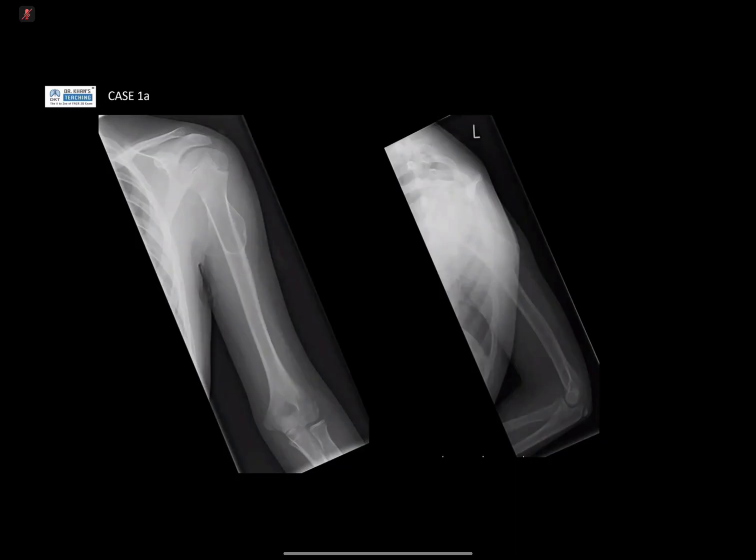Excellent. I'm sorry, I didn't catch your name. What was your name? Candidate 1. Candidate 1, lovely. Okay, so that was a really nice description, excellent description. I like that you ended on whether you felt the lesion was non-aggressive or aggressive. If this plain film landed in your reporting pile, with the clinical information given that this patient has pain, would you be suggesting anything?